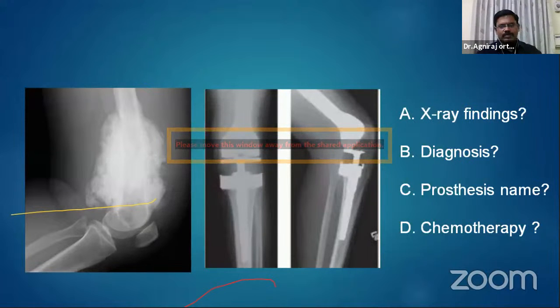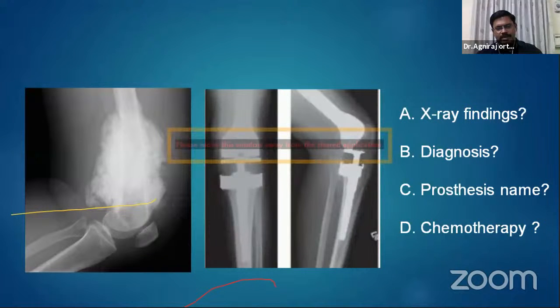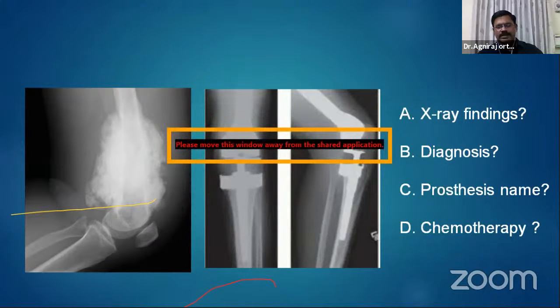Yes, there is some disturbance. Okay, Gautham, tell us, what are you saying now, sclerotic or lytic? Sclerotic lesion. Okay, then borders ill-defined, you told. Ill-defined borders, sir. Okay, go to the next.